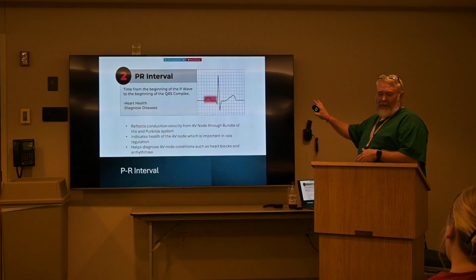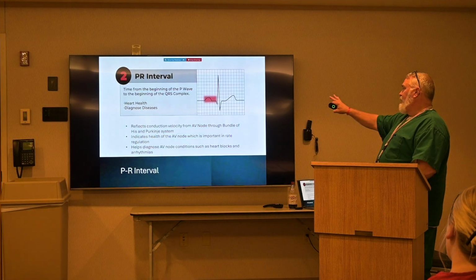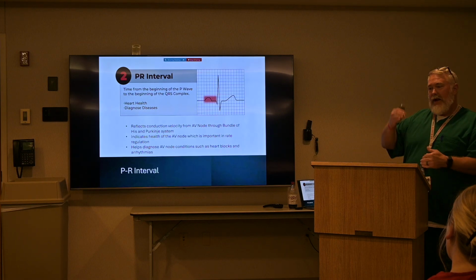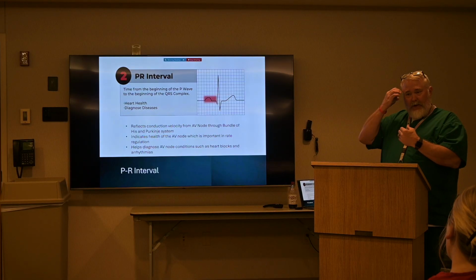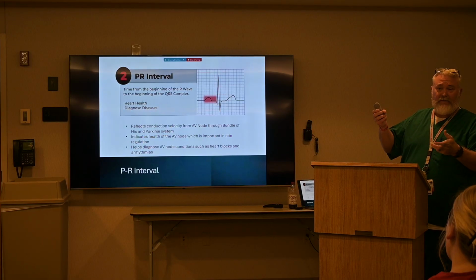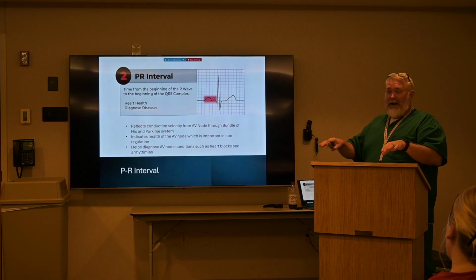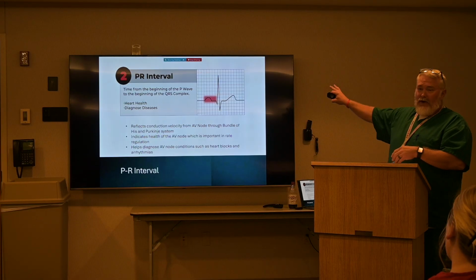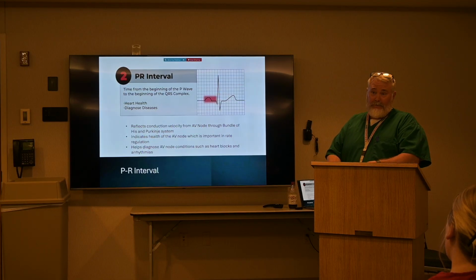And this is something I forgot to mention when I was talking about physiology earlier in conduction systems. This is important because without the P wave, that means your SA node isn't firing. Your AV node and then your bundles and branches conduct at a much slower rate than your sinoatrial node. Your sinoatrial node will conduct at 60 to 100 pulses per minute, your AV node from 40 to 60, and then on down is 20 to 40. So you're going to know you have an issue if you have no P waves and your rate is slow: you have an SA node problem, probably.